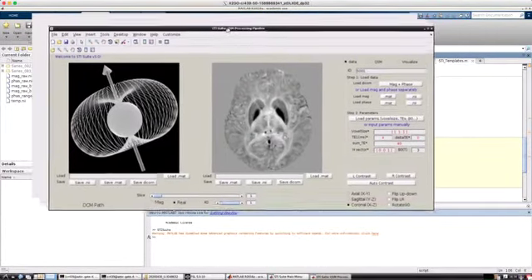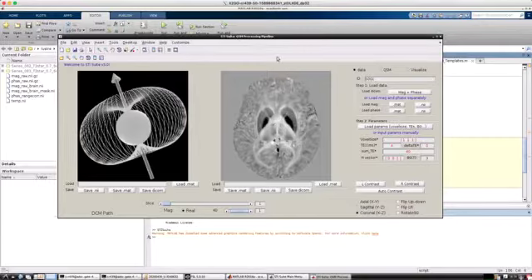Okay. Great. So this is what you can use. And the first thing, because it's a GUI, it has quite a few bugs. The first thing you need to do is actually set your parameters here. And I suspect this is because we load Nifty data, but I have not tried loading DICOM data. You are welcome to try this as well.